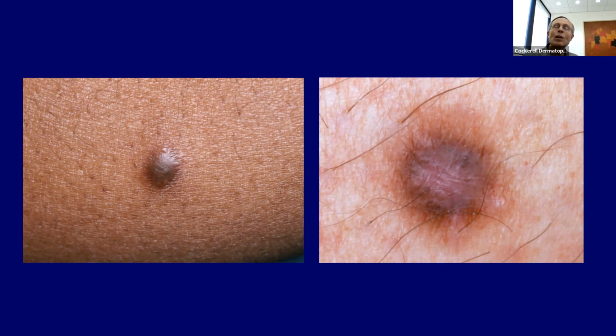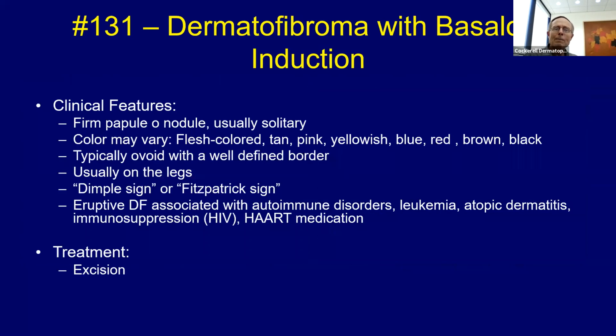And that's not a fatal misdiagnosis, but it's a diagnosis that happens because the dermatologist misguides the dermatopathologist, doesn't take a sample that gets deep enough. So just remember that that can happen as a sampling error. So dermatofibroma with basaloid induction.